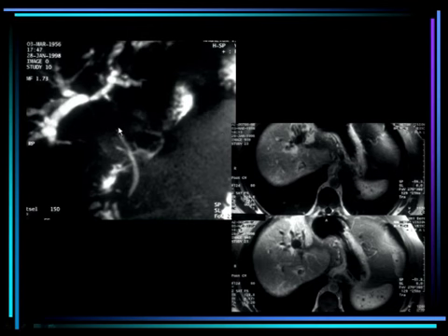We don't have a mass, we have a stenosis, and this is the MRCP. It takes 17 seconds to do that. You have by MRI intrahepatic bile duct dilatation. You don't know why you have the dilatation, but if you do MRCP, then you know extrahepatic cholangiocarcinoma.